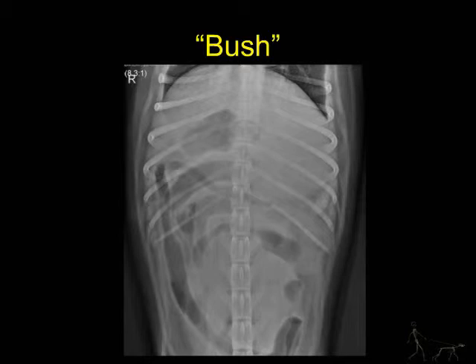Because the entire abdomen would not fit on a single film, both a cranial and caudal VD view of the abdomen was obtained. On the cranial image, the stomach remains moderately dilated with gas, as well as numerous small bowel loops remain moderately dilated with both gas and fluid.